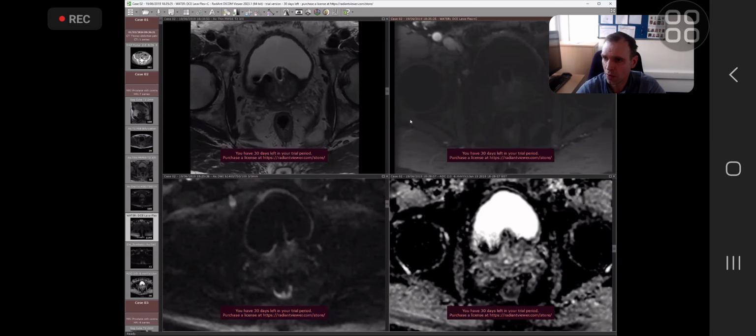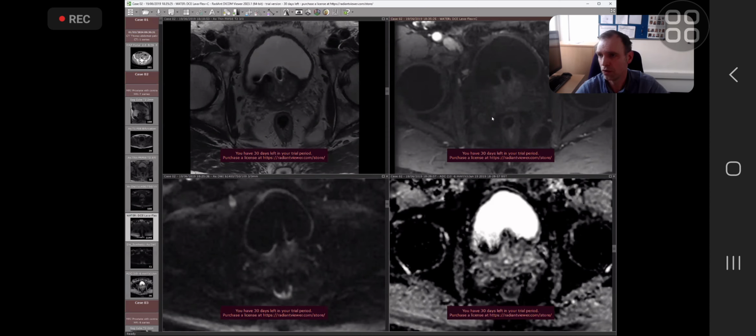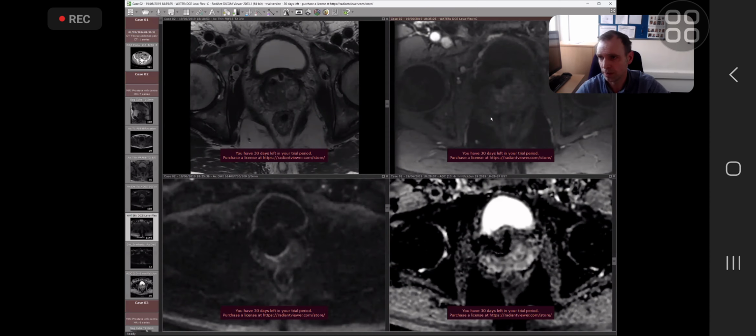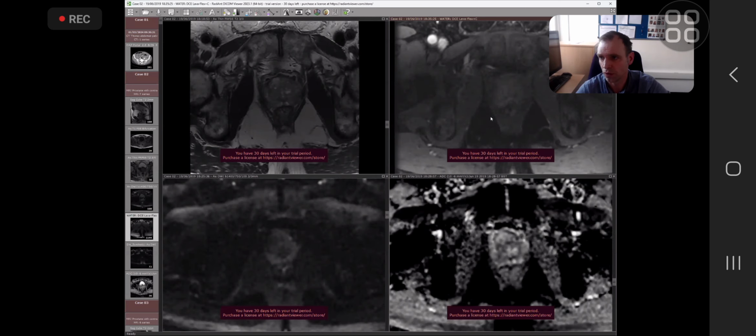So I will talk through how I do a case, but I would start with the T1 imaging first to make sure that there's no hemorrhage in the gland, and also I can use that to look as an overview of the bony pelvis. The T1 we typically do as a large field of view from the bifurcation downwards, so it includes all the pelvis. Have a look at the bony pelvis, the nodal stations, and any other incidental findings.